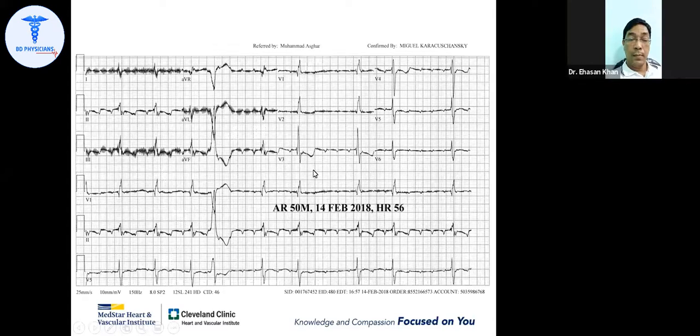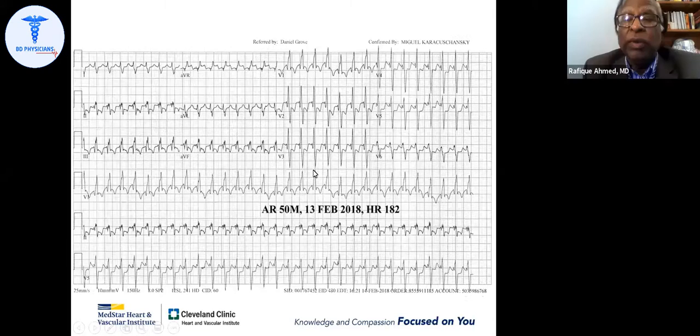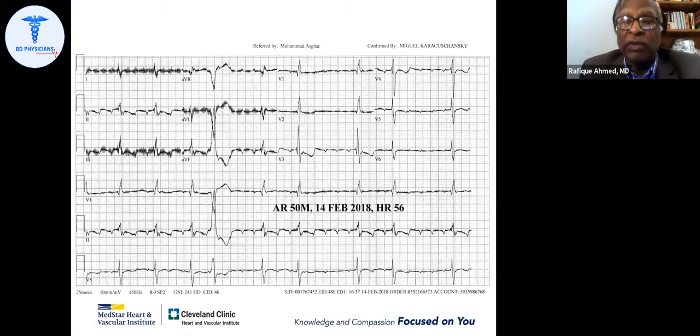So sometimes you need help. What we do, we look at this ECG, we say it is a supraventricular tachycardia, and that is good enough diagnosis. But you have to carefully look at it. It may suddenly look narrow, but it is not narrow. It's a wide QRS tachycardia with right bundle morphology, and it was an atrial tachycardia after giving adenosine.